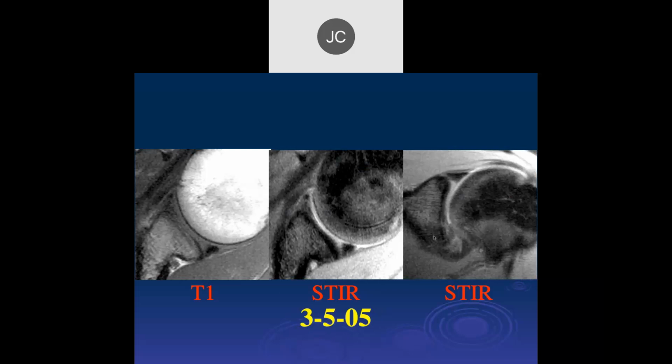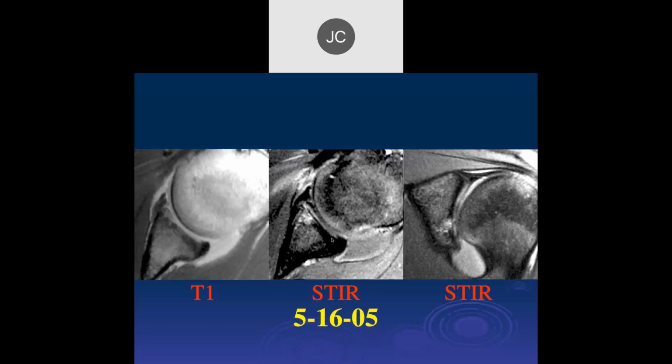At this point, we don't see a bone injury that we didn't see here, but 2 months later, without an intervening trauma that we know about, he now has a lot of subchondral cystic change here and probably disruption of the articular cartilage and the labrum. So what we usually think of as degenerative changes can actually occur pretty rapidly after these traumas.